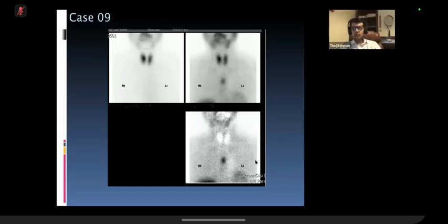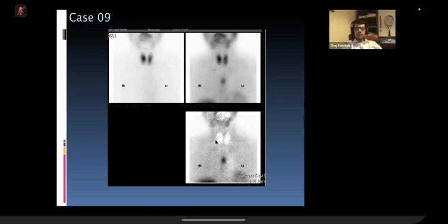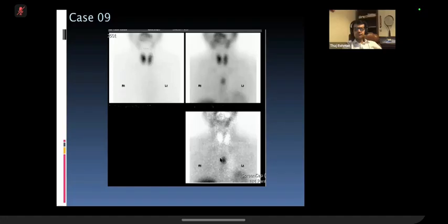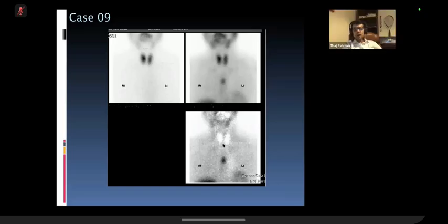What does the third image show? That my arrow is pointing. What has happened to the thyroid gland in the third image? So the tracer activity appears to have reduced, but in the inferior nodule, it continues to take up tracer. So maybe a parathyroid adenoma is the other possibility, given that there isn't any washout of tracer. So I would say parathyroid adenoma where? In the, it's inferior to the thyroid, so left. How inferior to the thyroid? How inferior to the thyroid?